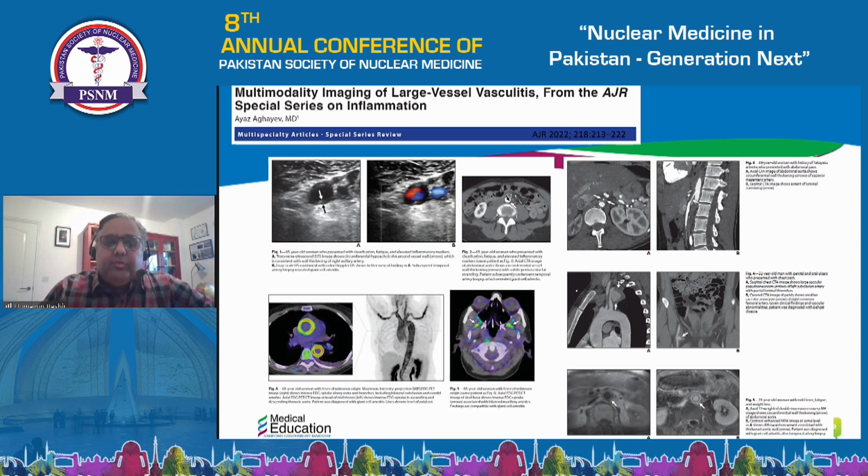This MIP view shows the entire extent of the aortic involvement, carotids as well as the subclavians, cut through the base of the skull as well. In this image on the left side, there's a saccular aneurysm. And at the bottom, we've got a few images of the MR as well. Again, we're looking at the thickening and the enhancement of the thickened wall. Next slide, please.